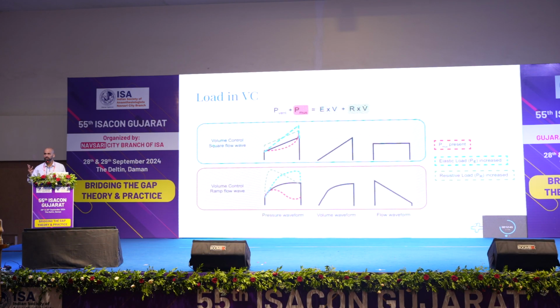and the pressure time scalar can show you three types of loads. If the black is your standard, how you should see it in the textbook. If you see it like the red dotted line, that shows PMUS or patient effort is present. If you see a step up and no change in slope, that's the green line. And if you see a change in slope, that is a compliance problem. You have to train yourself to see these patterns repeatedly, screen over screen.